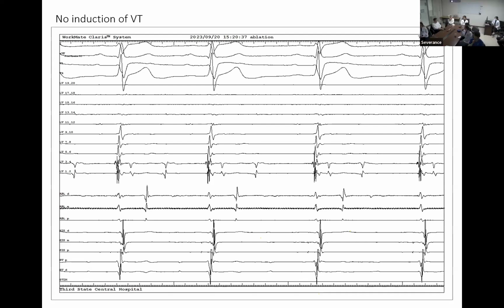Dr. Wang, can I ask a question? Yes, sir. So the delayed potential, the mid-diastolic potential, is a mechanical artifact, you meant? Yes, it is. Then how does it differ from the real P1 potential? Could you please explain how to define it?